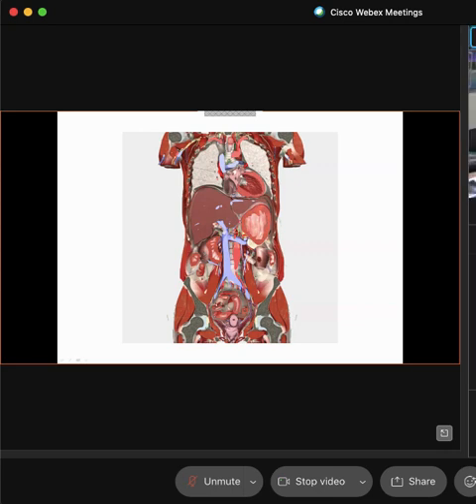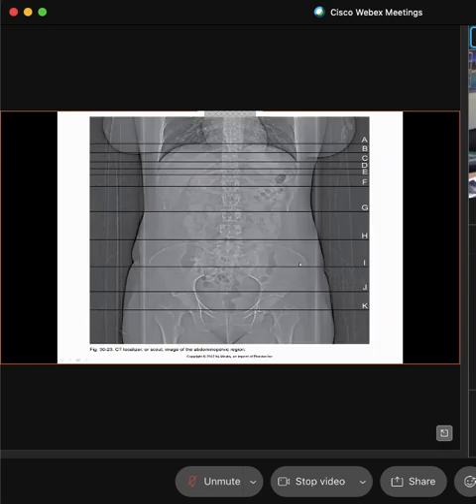And we can start to see as we go down the iliac crest, down the ilia, we know that we should see the sigmoid, the rectum, the bladder, and so on and so forth. So use your landmarks. Take a look at what you see. When we're looking at the abdominal pelvic cavity, high up we're going to see some lungs.